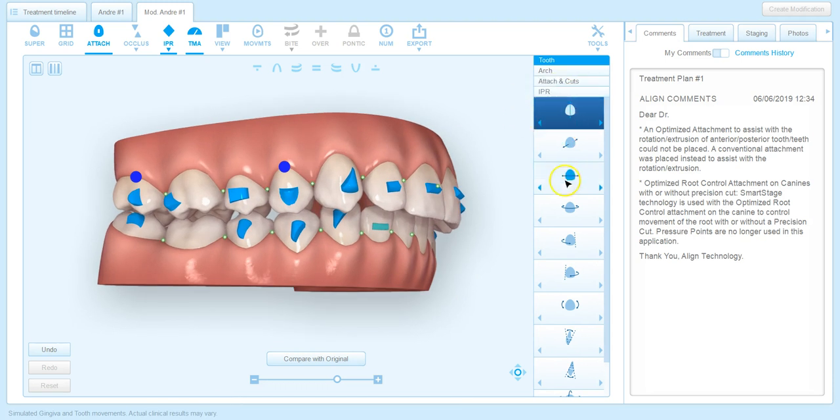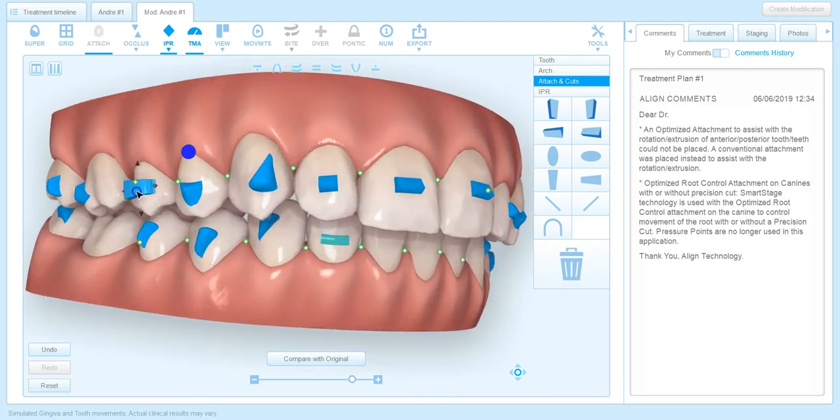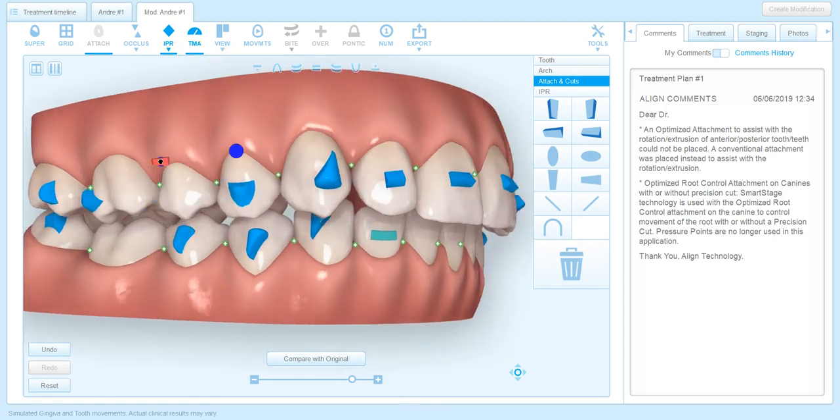Later on I'll go through all the options, but just to give you an example, we can come here to the attachments, and let's say, I want to make this attachment larger, or I want to angle this attachment a certain way, but it will allow you to just really play with all these tools here.